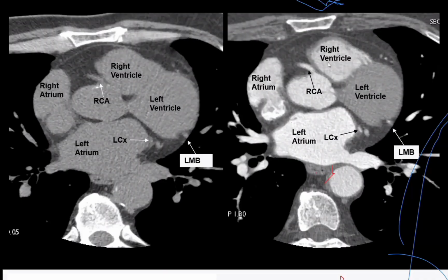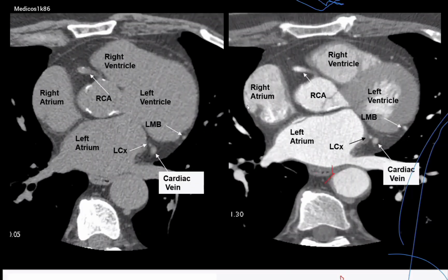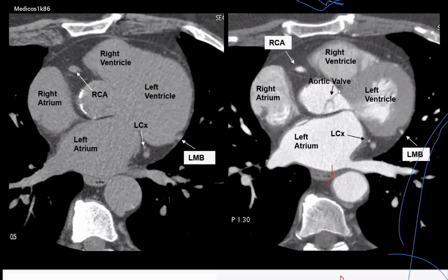then right ventricle, and let's go down, and it is still coming similar. Right atrium, we can see better, and the right atrium again. Finally, we saw some contrast in the left ventricle, and in the right ventricle there is also some contrast here, and the right atrium, right ventricle, left atrium. CX, as you see in the small images, is small mostly, and we can call it the right dominant system.